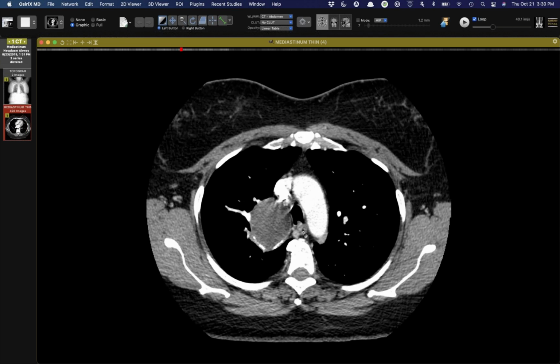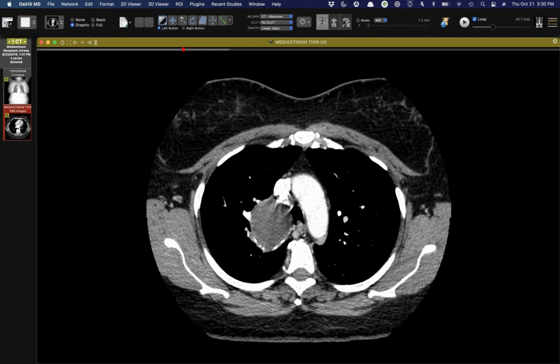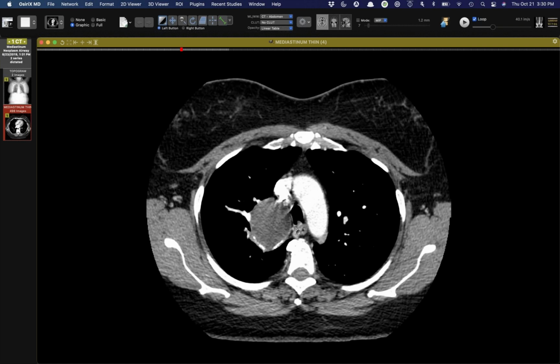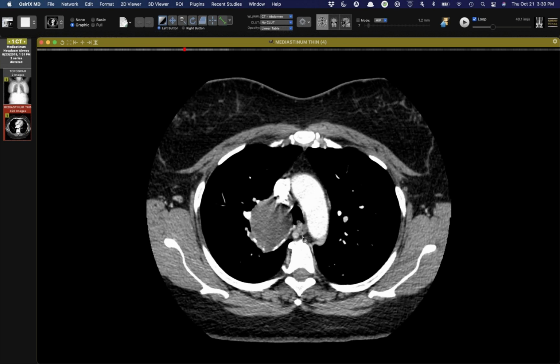So yeah, it's just a little leiomyoma. That's what it was. So smooth muscle, and it stained for smooth muscle markers. So arising from the membranous or muscular portion of the tracheal wall. So just a cute little incidental finding there. It's a good observation to even see such a small thing.